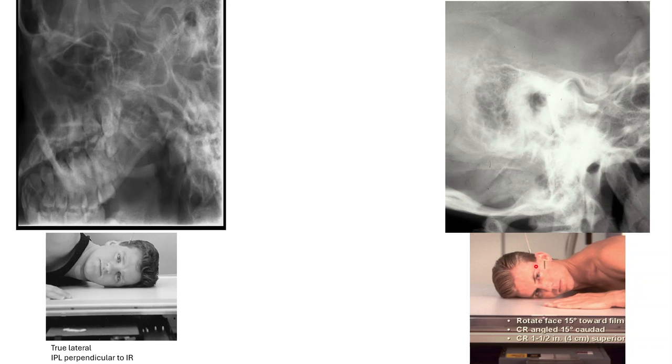So in this one, we can clearly see the rotation by finding the condyle not of interest. All right, this is the condyle that was projected inferiorly and out of the way. But we can see that it clearly is not in line with the condyle of interest, which is projected more posteriorly, or it's rotated, I should say, rotated posteriorly because of that rotation of the patient's head.